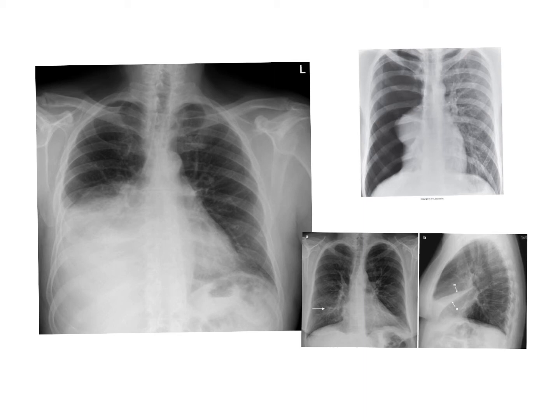We know from our anatomy class last year and from being in clinic for a little while now and seeing chest x-rays quite often that we should be able to see a costophrenic angle here usually. Now when we can't see that point, this costophrenic angle, we know that we have a blunted costophrenic angle here. And because we have a white color here instead of a darker color like we see up here or in the lung field, we know that we're dealing with something similar, at least, to fluid. And that's what a pleural effusion is, an abnormal presence of fluid within the pleural cavity.